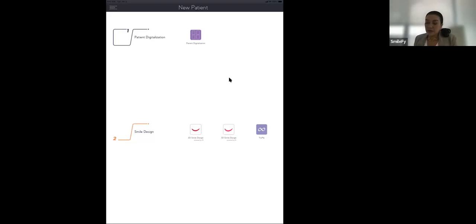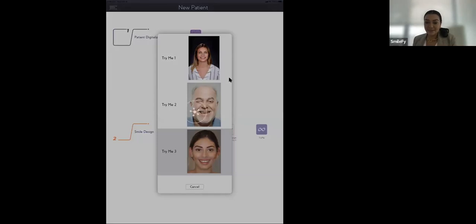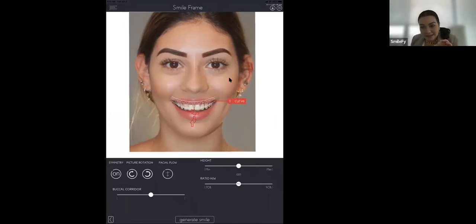So I want you to click on try me. And then after, please tap on try me 2D. We have 3 patients here. I'm going to select Maria. Let's give her a name, Maria. It's going to be try me 3. And let's get started. Remember that I told you there is a key for you to succeed with the smile simulation. And I want to bring this to you right now.